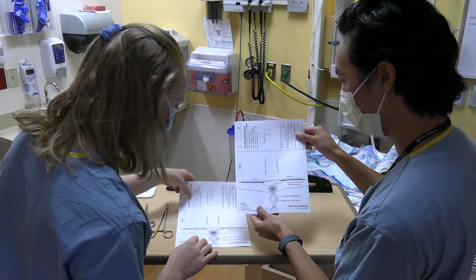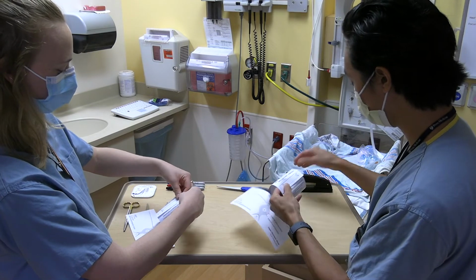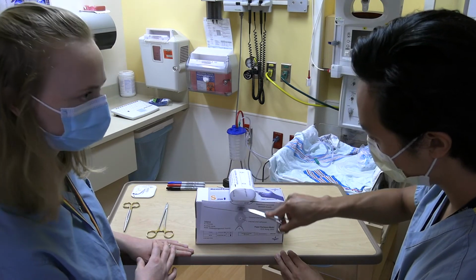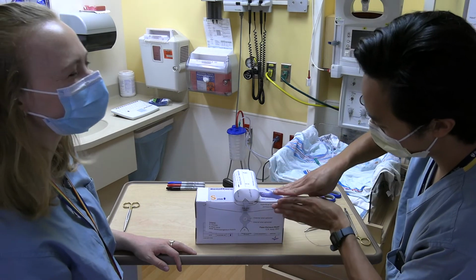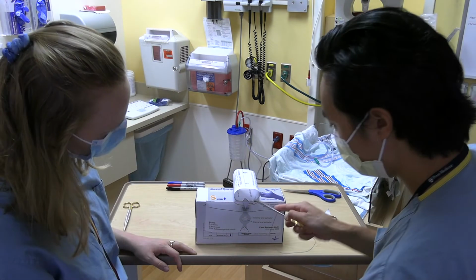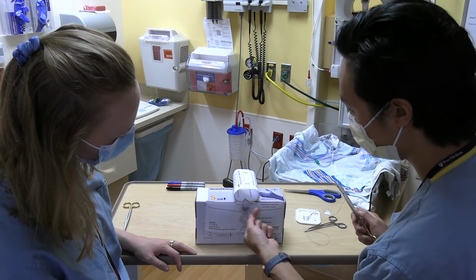We have found the paper perineum model to be a helpful tool for medical student and resident education, especially on the floor of labor and delivery units where these lacerations occur. Moving forward, we plan to conduct validation studies for this educational model. In conclusion, the paper perineum model is a low-cost and accessible three-dimensional model that can be used by educators to teach anatomic and surgical fundamentals pertinent to obstetric laceration repair. We thank you for your attention and welcome any questions or feedback regarding the model.